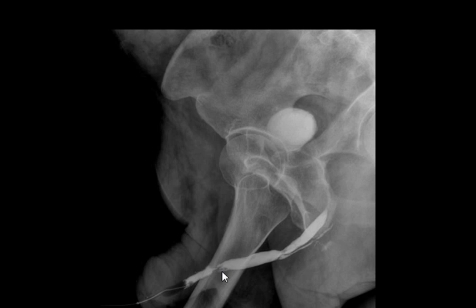Okay, and it's anterior. Well, it can be trauma also anterior, it happens. The penile urethra, if there is a pelvic fracture, it becomes posterior. In cases of pelvic fractures, which we don't have here. So anyway, traumatic instrumentation is also on the membranous, on the posterior part, the membranous.